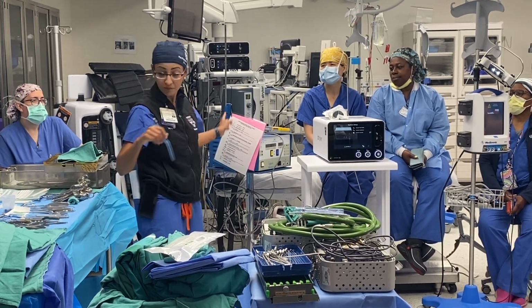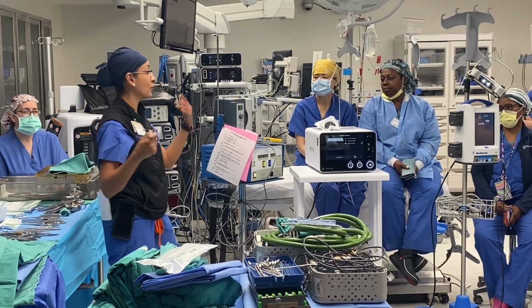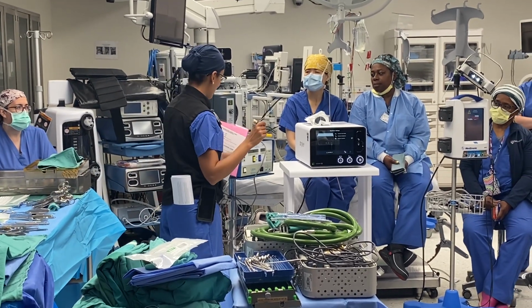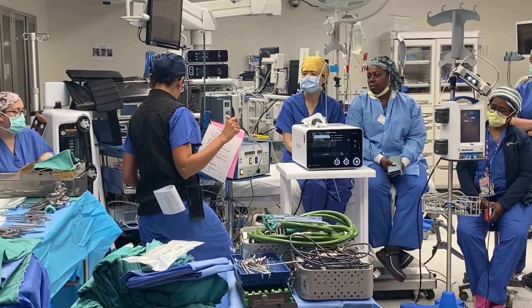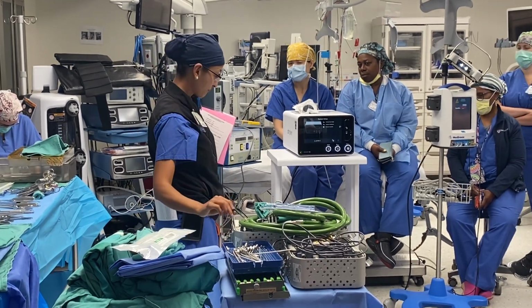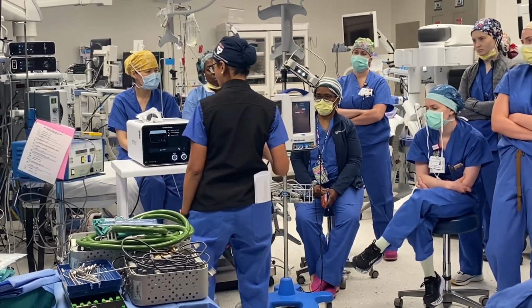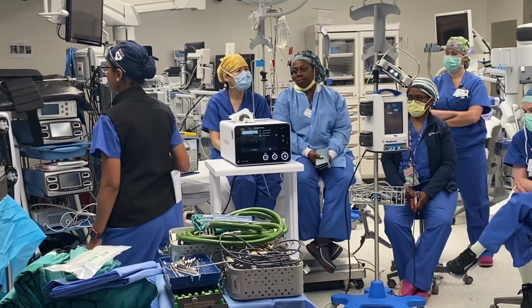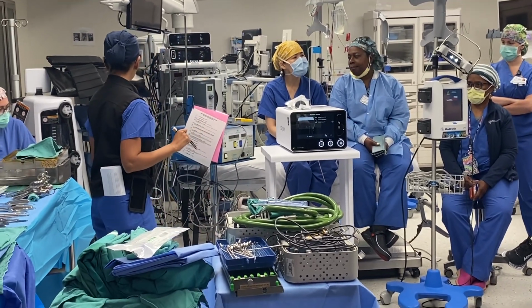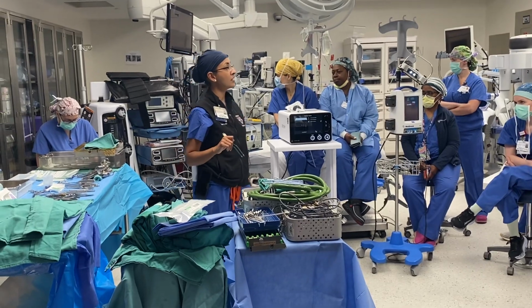But if we're doing irrigating, which often we are when we're inside the brain or inside the spinal cord, then this whole setup. This is the foot pedal for the big drill. This one has its own foot plate, which is this one. I'm looking around the room here. All of that you guys are familiar with.